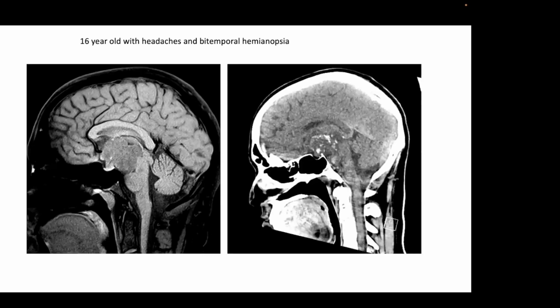I'll give you a hint. Here's the CT scan. So what diagnosis would you offer now? Does that support the diagnosis of craniopharyngioma?